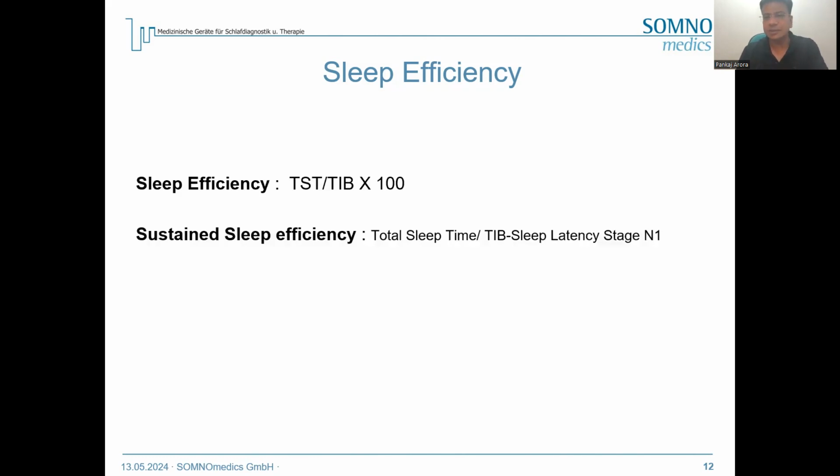So how do you define sleep efficiency? Sleep efficiency is defined by total sleep time. We know what total sleep time is. So total sleep time upon time in bed, into 100, is sleep efficiency.